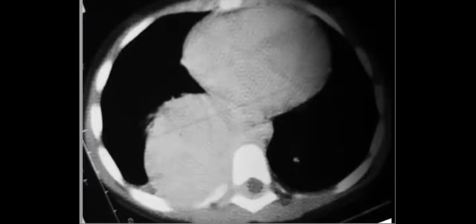So the most important modality you will use in the diagnosis of neuroblastoma, the best choice, will be what? I showed you MRI to be tricky for you. It's not MRI. The most important is MIBG, the gold standard of the diagnosis, because it takes up norepinephrine. So the most important is MIBG.